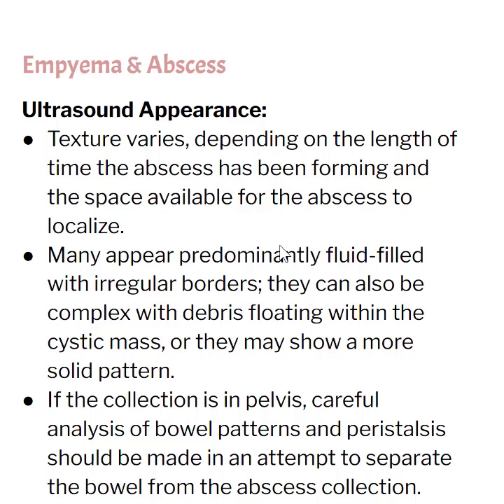When you see the abscess, they typically are going to be fluid filled with thick, irregular borders, but you also might see some stuff inside of it. So we consider these typically complex masses. That complexity might be some debris floating within it. It might have a fluid level. The bacteria might be producing gas, so there might be some echogenic foci within it that are causing ring down artifact. And because the peritoneum really does cover most of our abdominal cavity, abscesses are not uncommon, more towards the pelvis in the bowel area.